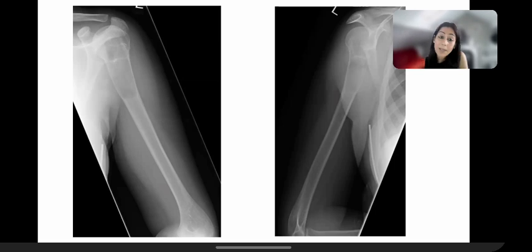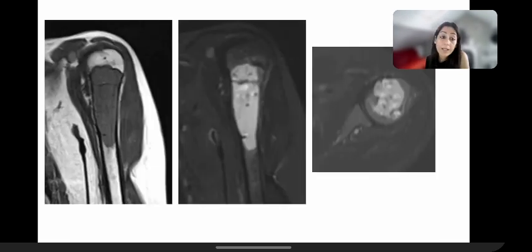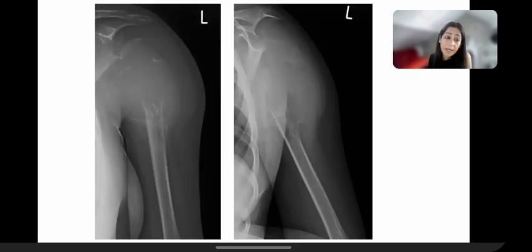So that was December 2015, and we did an MRI as well at this point, which once again shows this sharply demarcated and marginated space occupying lesion, T1 hypointense. Again, the surrounding marrow was completely unremarkable. There was some expansion, but the periosteum was completely normal. No periosteal edema, no periosteal reaction. So in December 2015, this was her MRI. And this is what happens in March 2016.